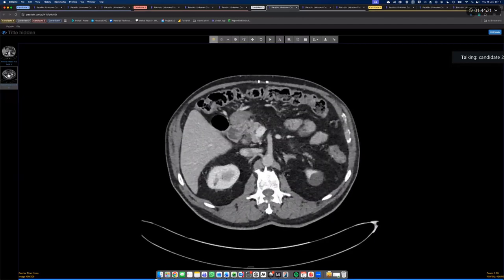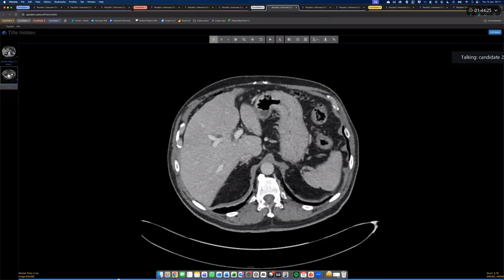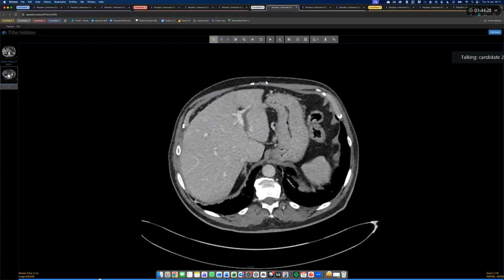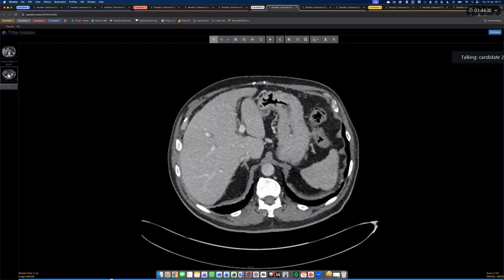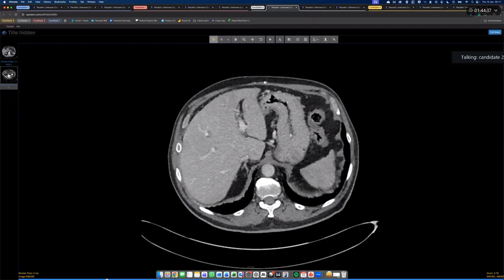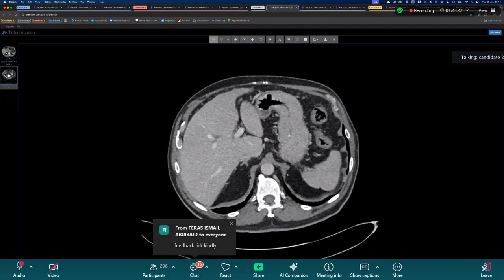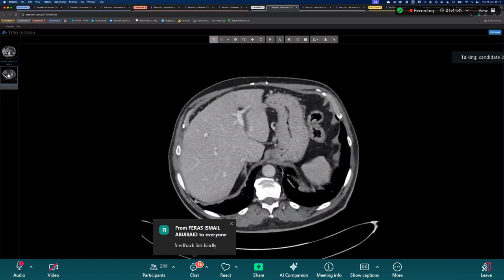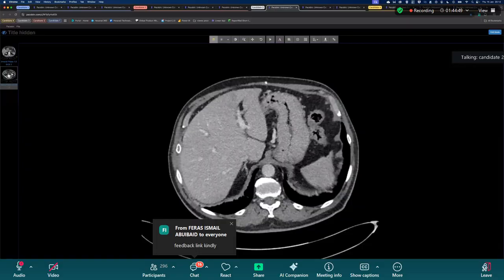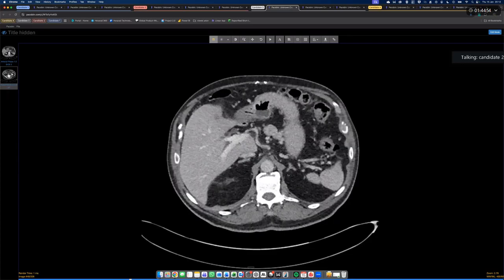In my routine practice, I'll be looking at the rest of the organs and peritoneum to rule out any peritoneal lesions. The stomach wall also appears to be a bit thickened, but it is also collapsed. It is more prominent in the region of the body and fundus, but it's smooth. I cannot appreciate any significant rugal folds of the stomach, so I would be concerned and I would like to probe for any history of stomach related problems.